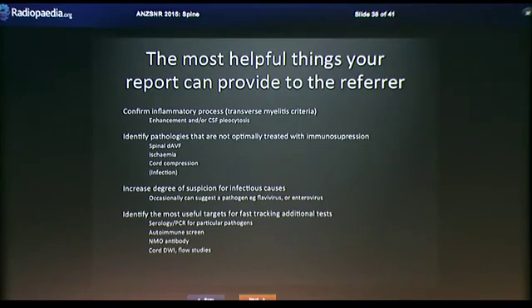So I've looked at a series of cases which I've grouped into particular imaging problems. With the T2 hyperintensity, it comes to us often as an undifferentiated, non-specific looking thing on imaging. What you need to do is identify pathologies that aren't optimally treated with immunosuppression, because the reflex of the clinician is going to be to give steroids until they work out what's going on.